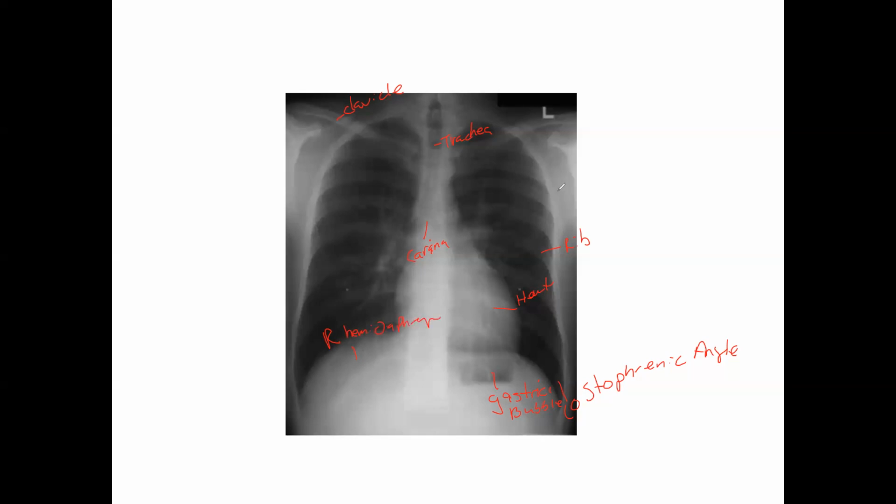Let's see here, the scapula's over here, and you got them on both sides. I'm just picking out one. This area here would be your hilar region or hilum, and then you've got to be able to visualize the anatomy. But this little bump that you see right here, your aortic arch or your aortic knob. And those are some things that we should be able to pick out.